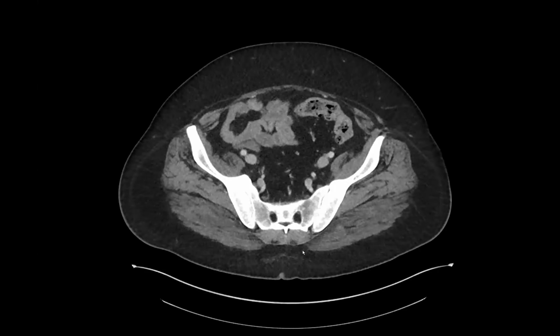So before telling what it is, the bottom line is anytime we see NSIP, always think of something secondary causing it, more so connective tissue disorder, regardless of the gender. This is a male patient, or it could also be drugs which can cause the NSIP pattern.